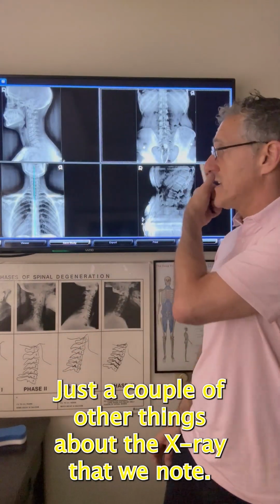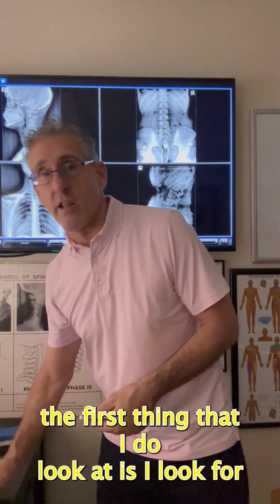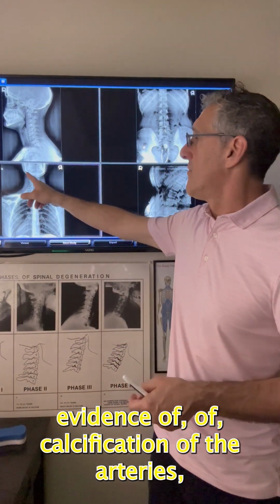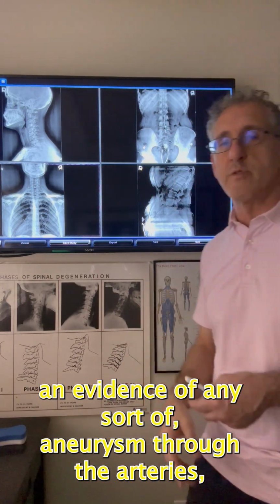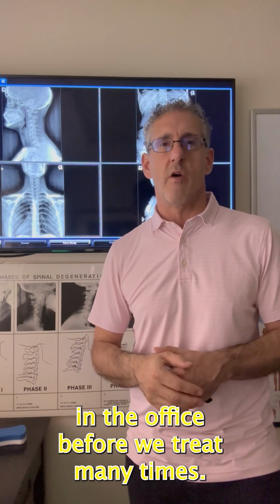Just a couple of other things about the X-ray that we note. The first thing that I do look at is I look for if there's any pathology, if there's a tumor, if there's a fracture, there's an infection, if there's any sort of evidence of calcification of the arteries, if there's an evidence of any sort of aneurysm through the arteries.